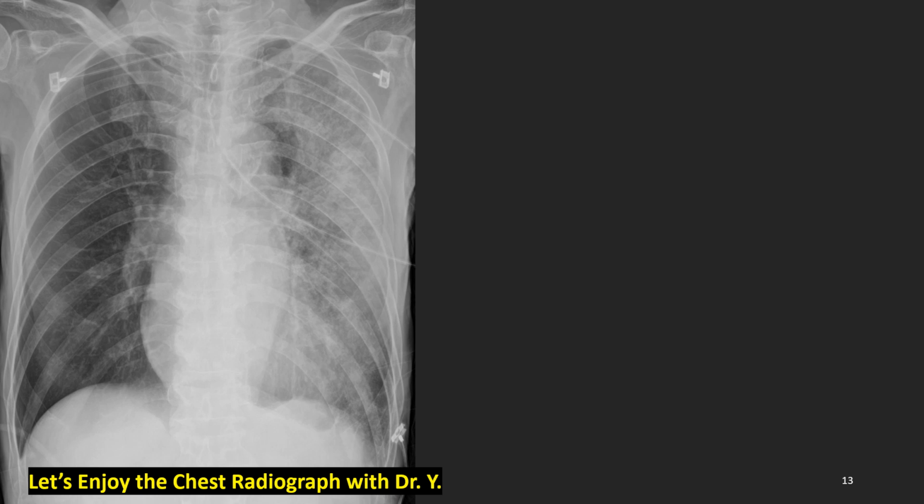How about the aortic arch? The margin is clear with a black line and some normal small airspace. And what about the left heart border? Obliterated. And how about the CP angle area? Somewhat alive. And what about the aorta line, the descending aorta? It's preserved. That means upper lobar involvement. This is left upper lobe pneumonia.